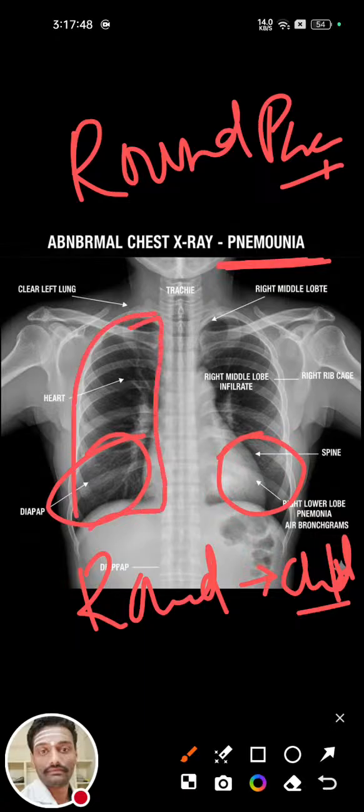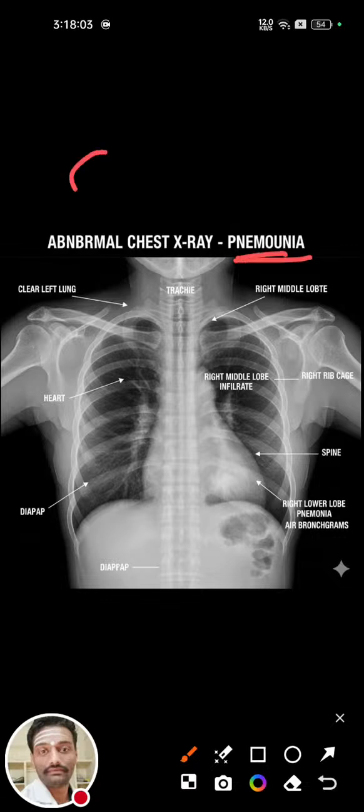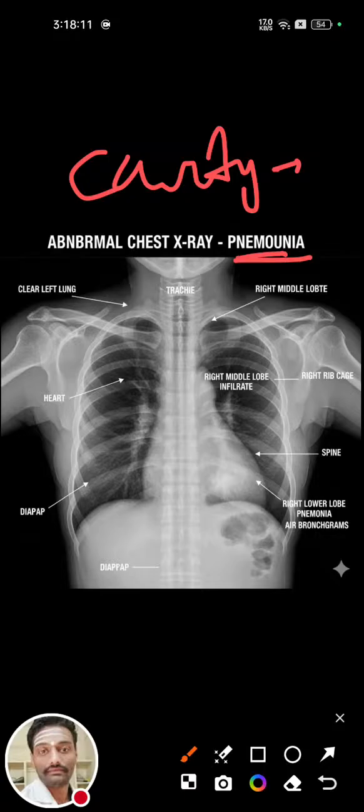We all know the right lung has 3 lobes and the left lung has 2 lobes. And in the pneumonia case, finally check if any cavity is present, an area of cavitation within the consolidation. It may show an air level or fluid level. Okay, and look for staph aureus, Klebsiella, tuberculosis, or anaerobic aspiration.